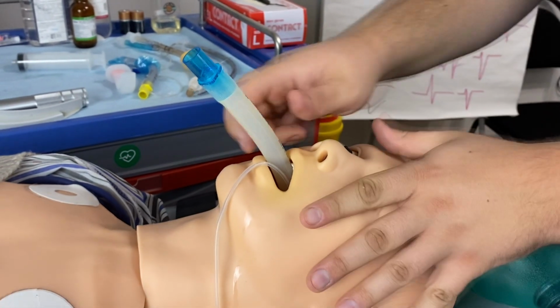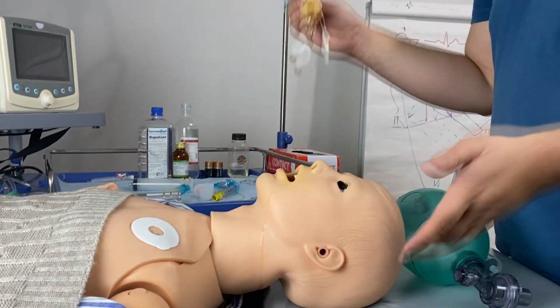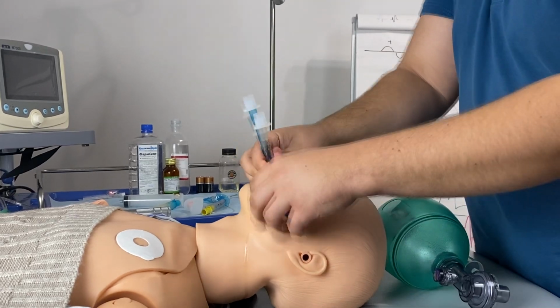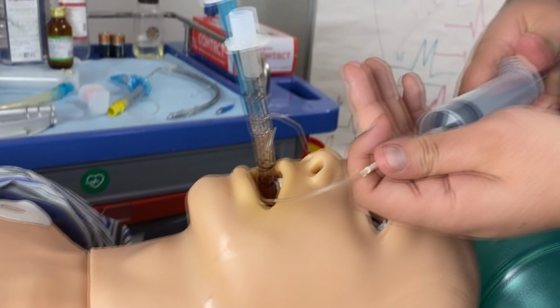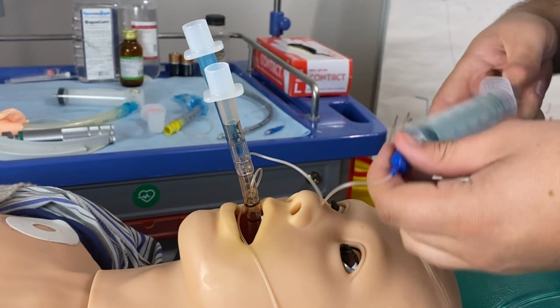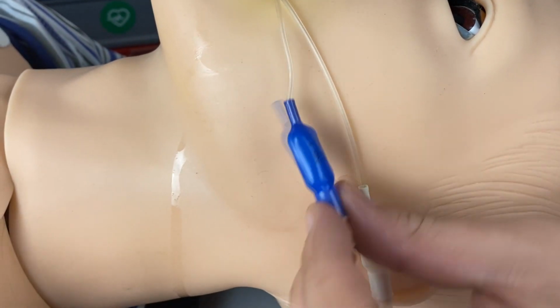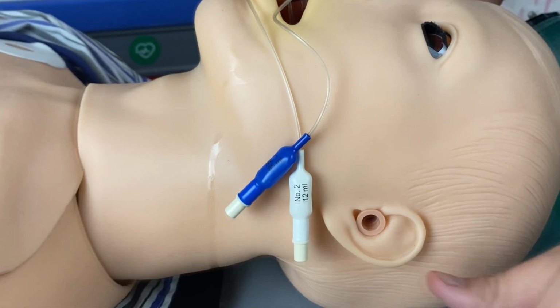And you get the idea how we remove this tube. For the Combi tube, it is absolutely the same. Also get it down inside the patient. Now these cuffs are small, so we don't have to use a large syringe, but we may if we need. So we inflate both of these cuffs. See that they're inflated. You can even see the volume that you need to inflate them. So it's up to 85 and 12 milliliters.